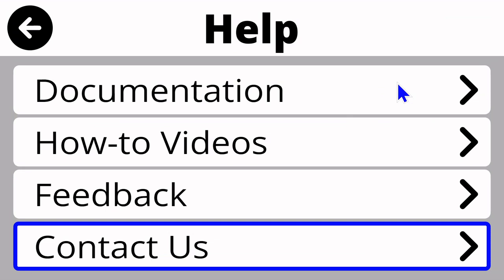So that is an overview of our help application within the Prodigy for Windows software. As you're taking a look at this, go back and complete that feedback form and let us know how we're doing. It's the only way, again, we can continue to improve our products and services to meet your needs. And so that feedback is ultra important to us.